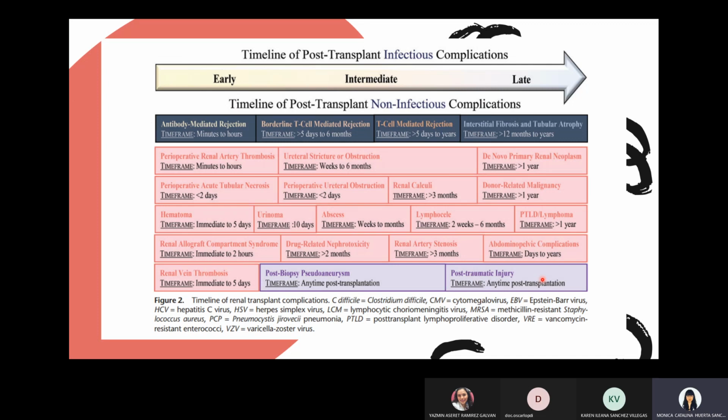So I found this case interesting because even though we don't have a lot of culture of organ donation in our country, there were two kidney transplants performed on the same day, and we performed the Doppler ultrasounds 12 hours later on the same patient, one right after the other, and both had signs of complication. This patient had a high resistive index, and the other patient had high velocities on the hilum. After 24 hours, we performed a follow-up ultrasound on both patients, and this patient still had a high resistive index, and the other patient had developed a hematoma.